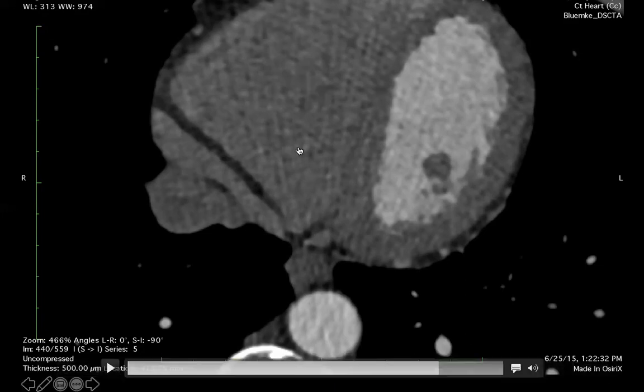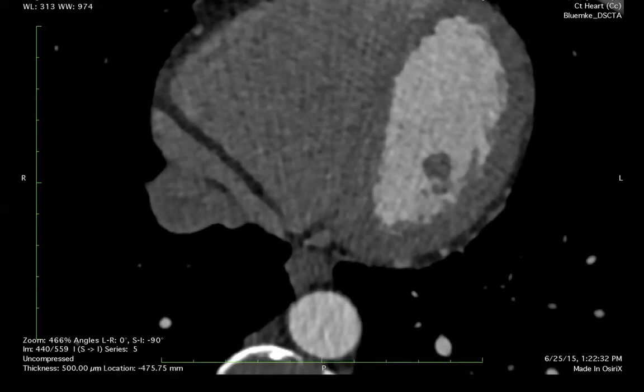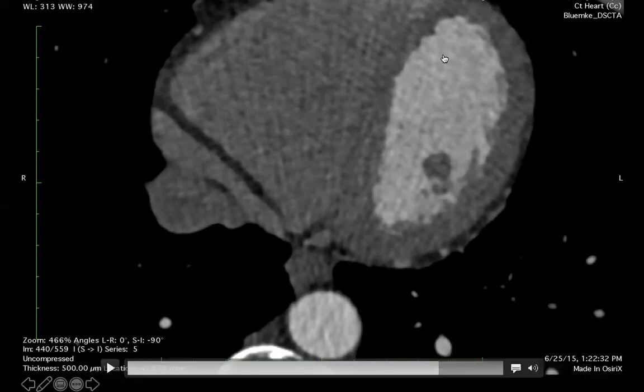We can measure the root mean square deviation of this background if we're going to measure signal to noise. However, most of that variance comes from this pattern as opposed to some underlying Gaussian noise function. Is that an appropriate measure of noise? Well, probably for some applications, it's just fine. And in the left ventricular blood pool, we have a higher Hounsfield unit number. This is probably around 500. This is probably around 100 at this point. And again, you see that there's uncertainty in that.